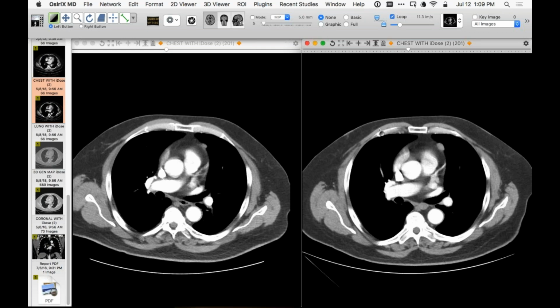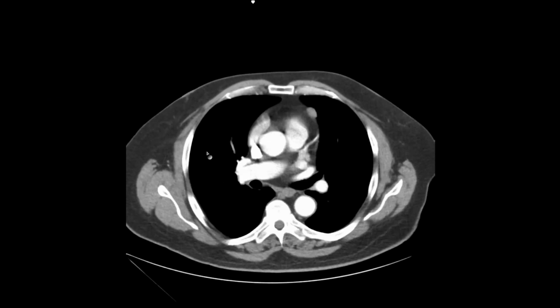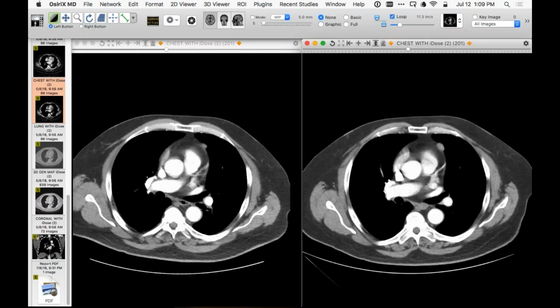But they took that out, and it is a thymoma. Just a typical small thymoma. So there you go. Thought that was quite cute. It's interesting that it's not quite in the central part of the mediastinum in the usual place. It's a little bit offset. But I could not have diagnosed that as such necessarily.